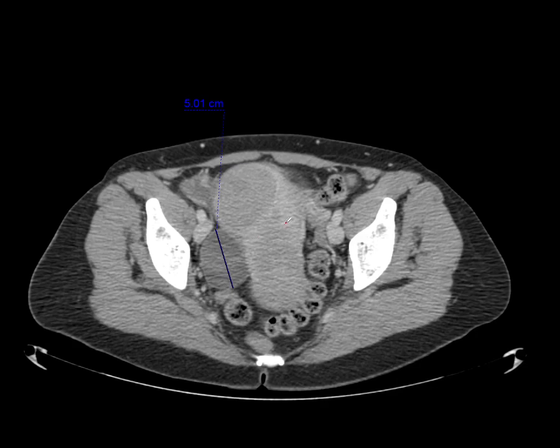Just like a follicular cyst, if we identify a hemorrhagic cyst which is 5 centimeters or less, we can consider that to be physiological and no further imaging is required. If it's greater than 5 centimeters, we should obtain a rescan within 2 to 3 cycles.